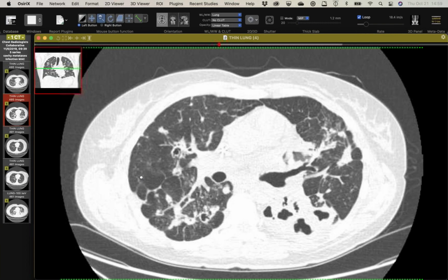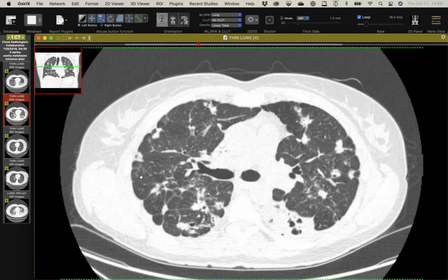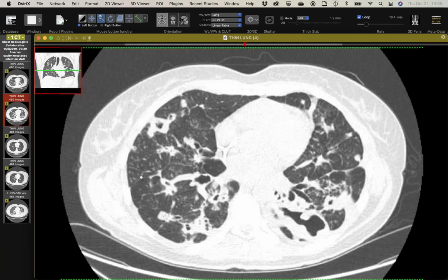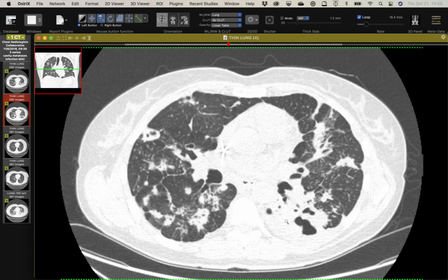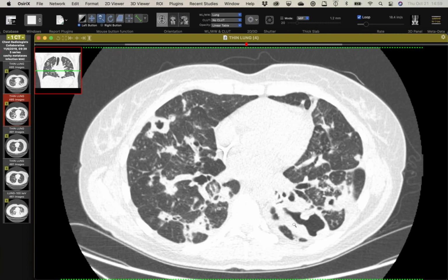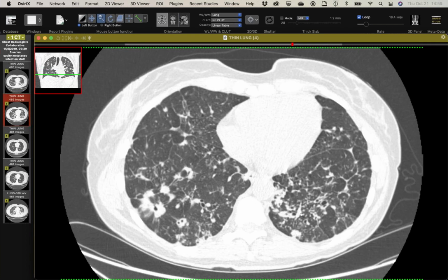There's a few along that septum there, but we were figuring out, is this all new tumor that developed in the course of a few months? Probably not. Is this another infection? Is this histoplasmosis? She's only on bevacizumab at this time, plus her antibiotics. Or is this just spillage from this evolving cavity that's now got bronchiectasis? With the MAC being treated, is there developing fibrosis, and maybe between the two there's some progressive cavitation, and it's just spillage. But it's so diffuse, and it's more lower lobe, I'm not thrilled with it all being spillage.